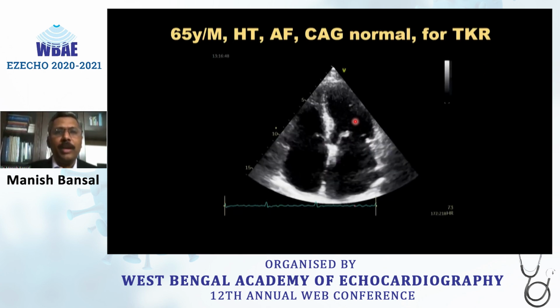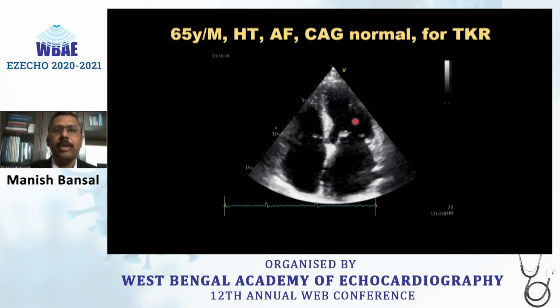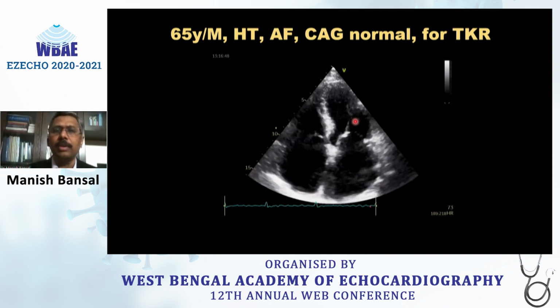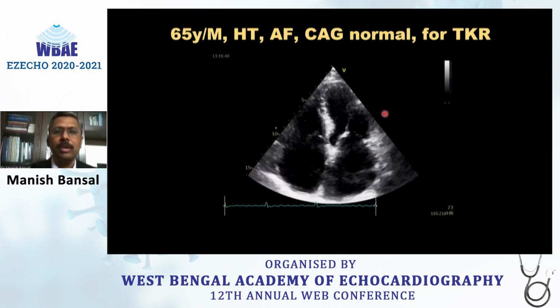So here we have a 65 years old gentleman, hypertensive. He was known to be having AF for the last 3 years. His coronary angiography 3 years back was normal. He presented to our hospital for knee replacement, and from there he was referred to us for preoperative cardiac evaluation.